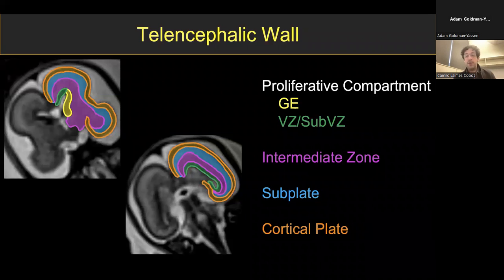Now, for neuroscience, the subplate is getting an incredible amount of attention. I am told by folks that know a ton more about neuroscience than I do that when you compare the brain of a human fetus to that of a non-human primate, that apparently humans have this humongous subplate. So, to purists and neuroscientists, this is one of the things that makes us stand out as human. The second reason to pay increased attention to the subplate is that it is quite vulnerable. And we've known that from studies in congenital heart disease and preemies, that the subplate neurons are actually very frail and easy to damage.